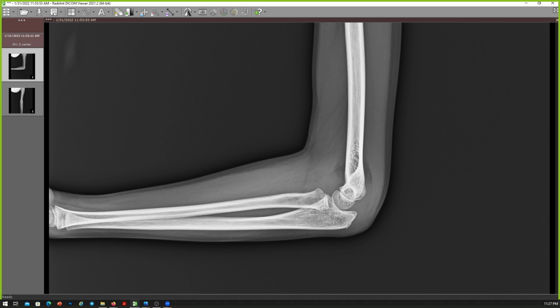Okay, I'm presented with an elbow radiograph, lateral view, for a skeletally immature patient. I cannot appreciate the side marker on this view. I can see an elevated anterior fat pad with positive posterior fat pad sign denoting joint effusion. Now I will look for any intra-articular fracture.